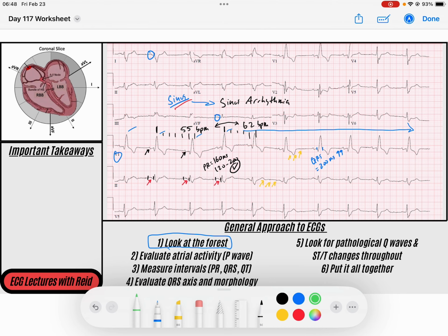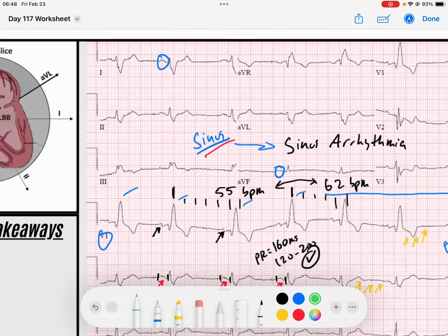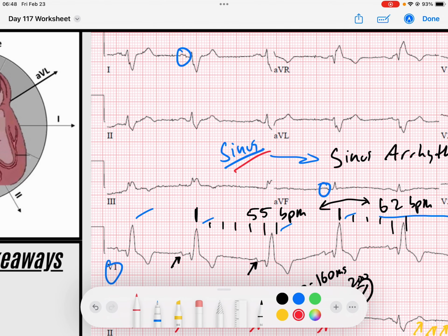And so we'll change things up. We'll start off by looking for our left bundle branch block. So I look in the lateral leads, and I don't see any evidence of a left bundle branch block, right? But what I do see is these slurred S waves in the lateral leads. And that slurred negative force tells me that we have late forces going from the left side to the right side because they're negative in the lateral leads, right? You come over to these lateral leads here, which are leads 1 and aVL, and we get the same thing, slurred S waves, right? So we have late forces going from left to right. That makes me think that this is a right bundle branch block, right?